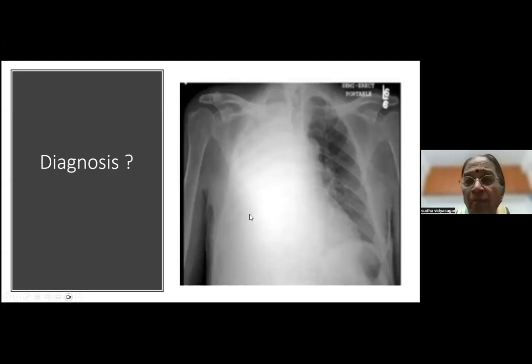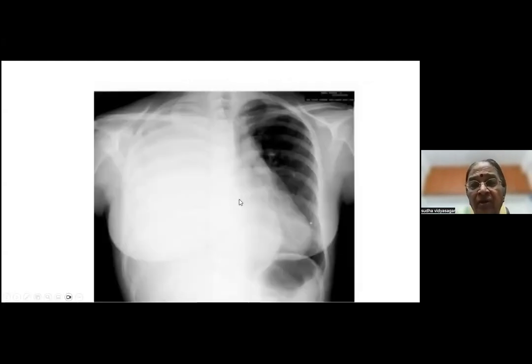Okay, fine. So that's probably a consolidation. We always say probably because we are never very sure. What is this X-ray? This X-ray, please. Effusion. Okay, at last we agree on something, isn't it? We are not divided down the middle.